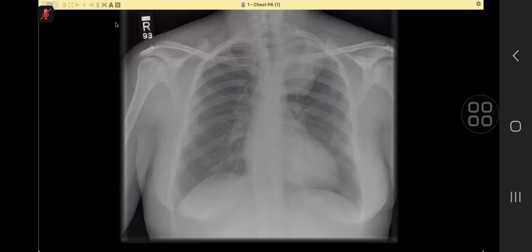Okay, this is a frontal chest X-ray of a skeletally immature patient. From the first instance, I can see a left-sided upper soft tissue opacity involving the anterior mediastinum, posterior mediastinum, which appears not to fade above the clavicles, so it's suggesting a posterior location.